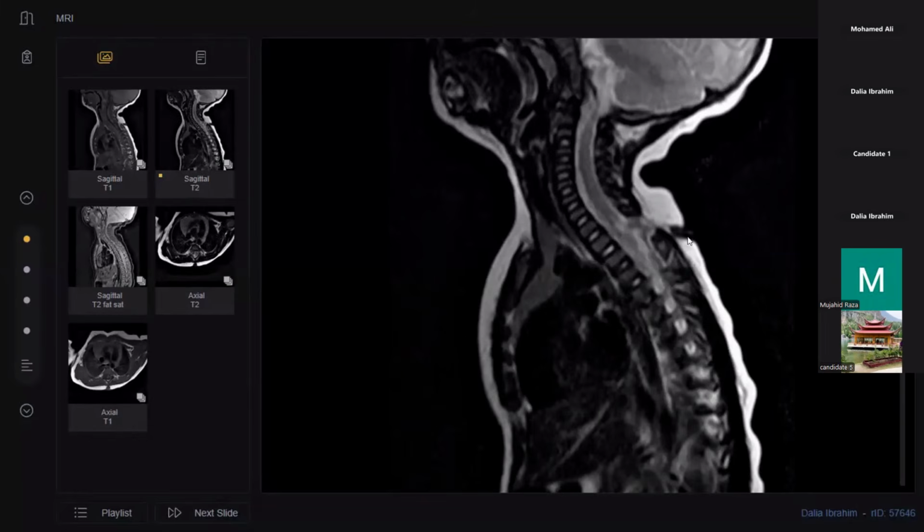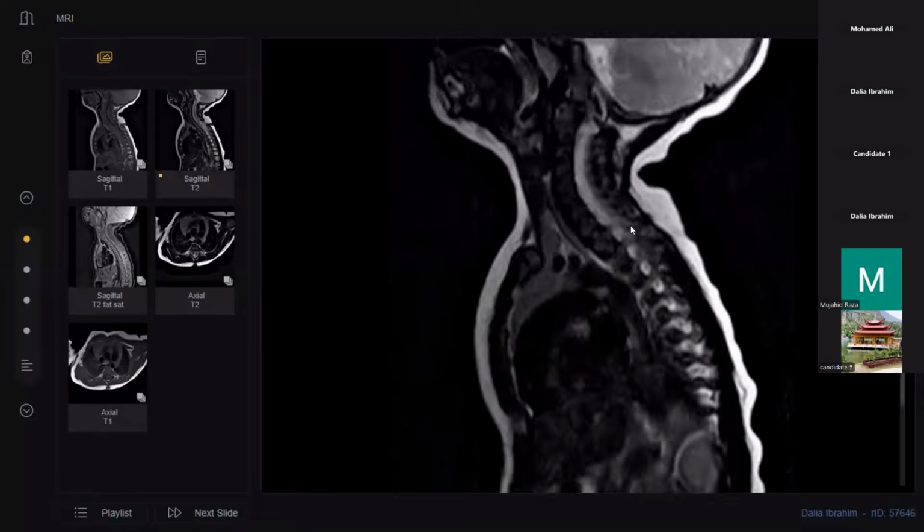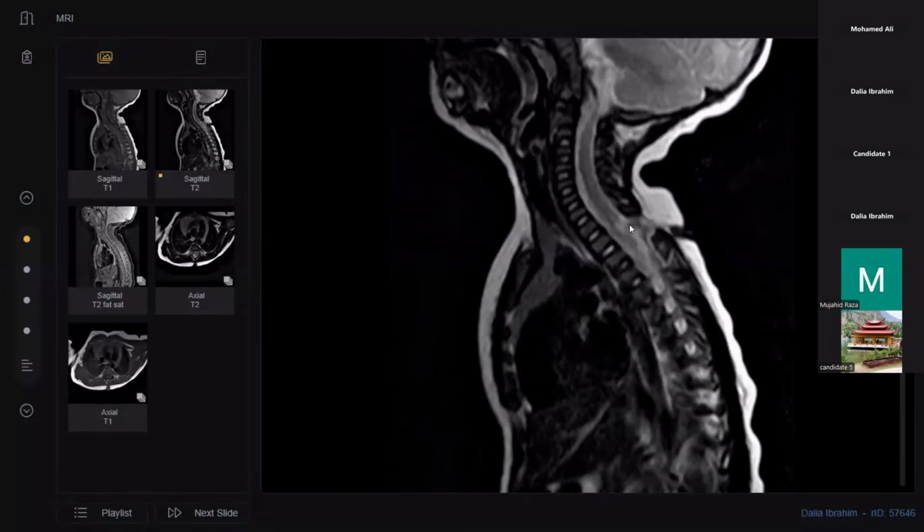This is the part of the skin tag, which is a fibrous tract underlying the subcutaneous tissue with very thin fibrous stalks, again extending through a large spinal dysraphism, attached to the dorsal aspect of the spinal cord, leading to tethering and focal syringomyelia at this region.